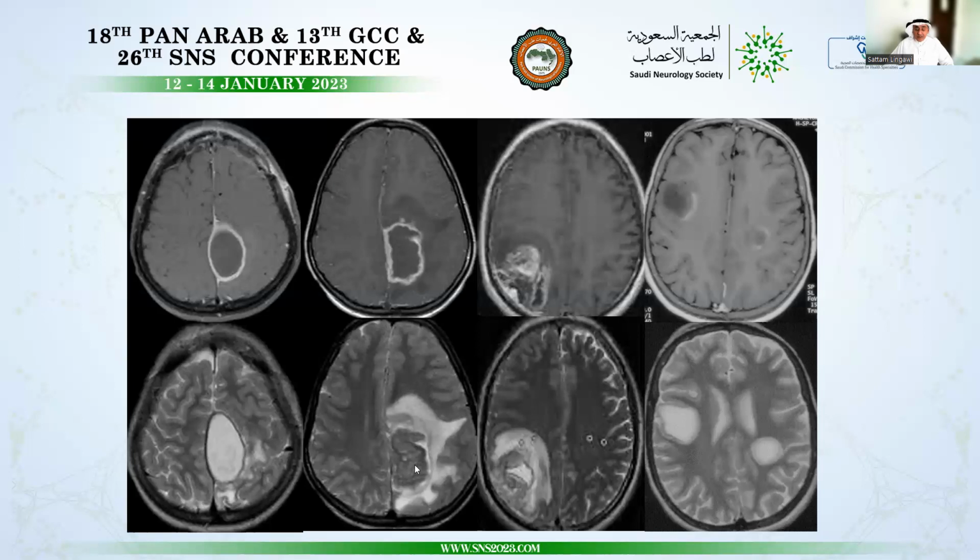Another reason for the low signal intensity center on T2 is the presence of hyphae with microcalcification within. Here, there is extensive vasogenic edema around it, because the treatment has not been started yet. The third case is actually a mass lesion that shows an amorphous, irregular, ugly pattern of solid enhancement with areas of central necrosis. The central necrotic areas show high signal intensity on T2, and the solid lesions remain of parenchymal signal intensity. This is glioblastoma multiforme with surrounding vasogenic edema.